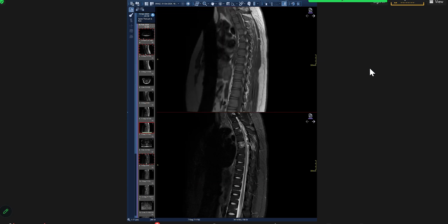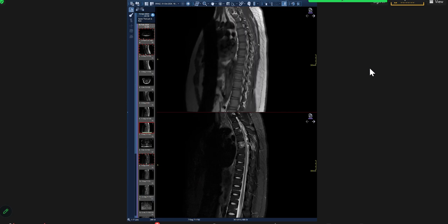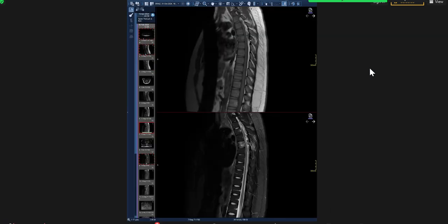There is also altered MR signal in the adjacent vertebral body and posteriorly in the lamina and the pedicle. I would confirm on the axial section that there are some T1 hyper- and hypointensities in the extra-axial lesion within the spinal canal.